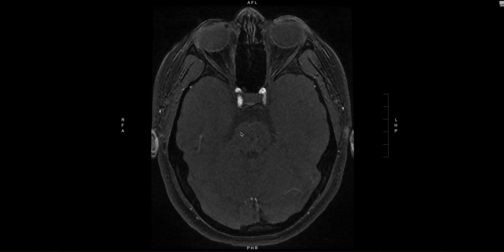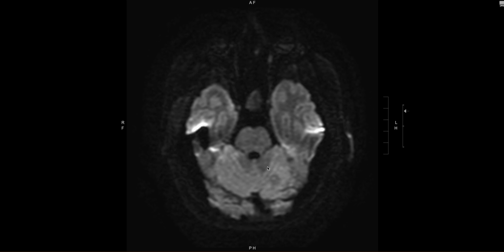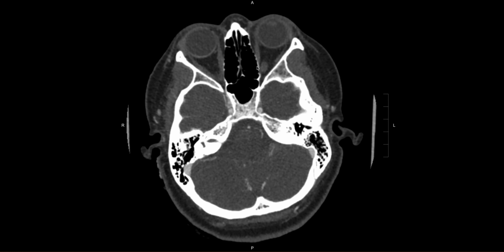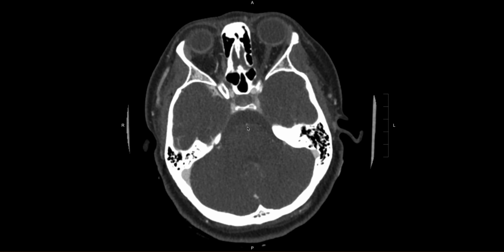So overall, this is pretty concerning, especially given that on this initial MRI, there were posterior circulation infarcts, like in the cerebellum here. So this patient ended up getting a CTA for further evaluation, and here we start to see the same pattern where we look at the basilar and we see that it's very irregular, probably goes out there, some distal reconstitution.